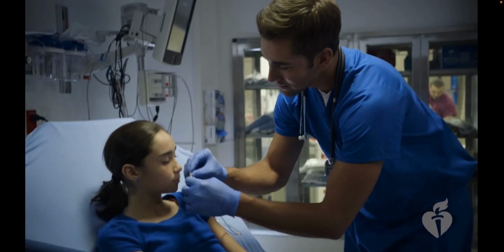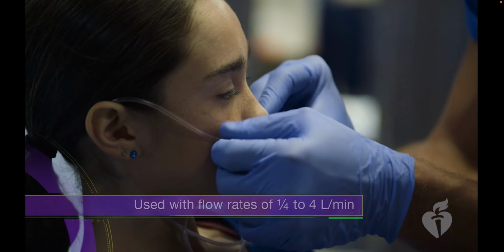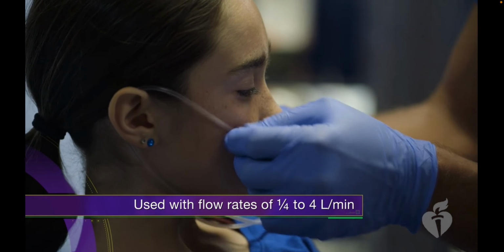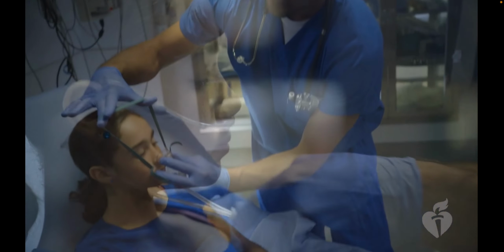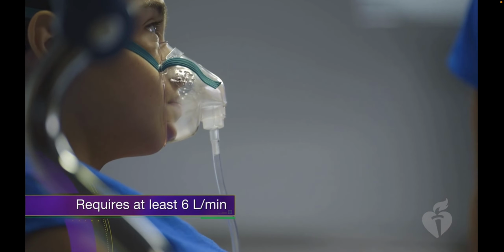Examples include simple nasal cannula and simple masks. A simple nasal cannula is generally used with flow rates of 1/4 to 4 liters per minute. A simple oxygen mask requires at least 6 liters per minute, but 6 to 10 liters is generally provided. Some patients will need more support than a low-flow oxygen system. High-flow systems may be helpful for these patients.